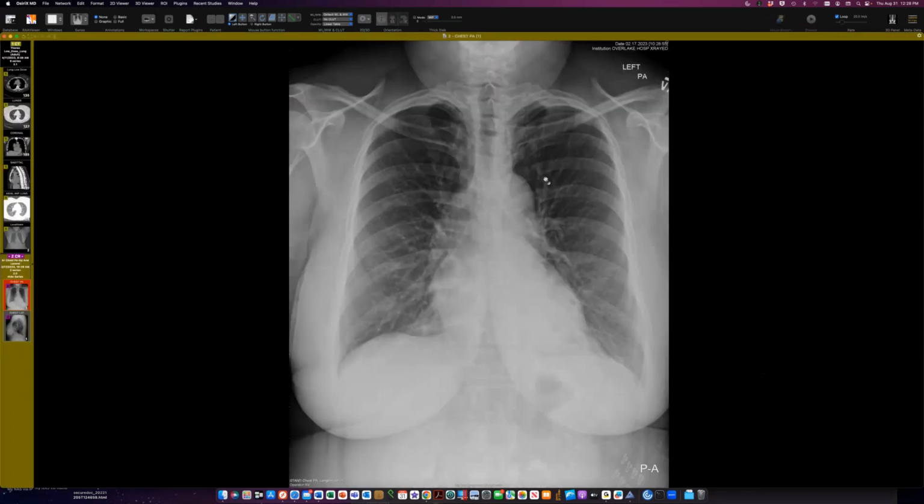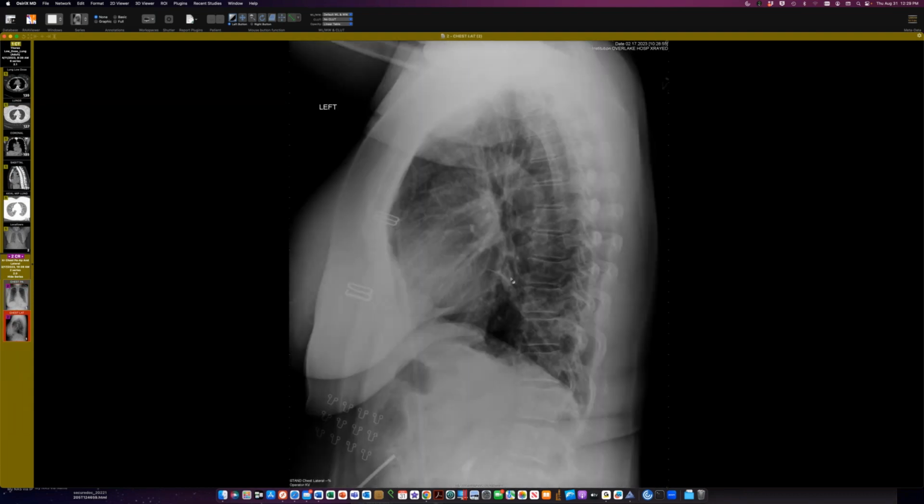So I hope you can see a fresh radiograph here. This is a person who presented with fever and cough and has consolidation in the left lower lobe. You can see it better on the frontal radiograph, obscuring the descending aorta, than you can on the lateral, but it's lurking back here. So it doesn't occupy the entire left lower lobe, but there is this increased whiteness here, giving us a little bit of a spine sign back here.